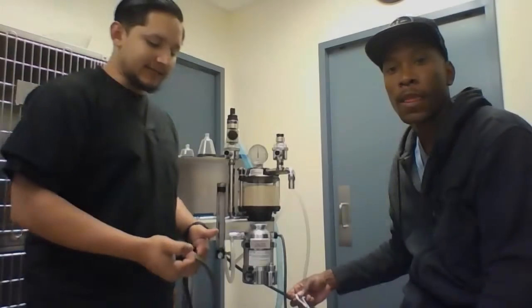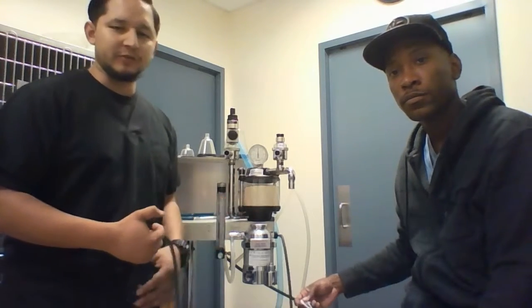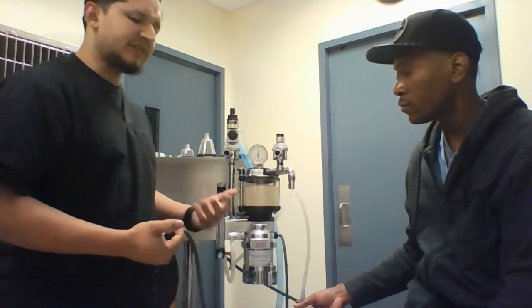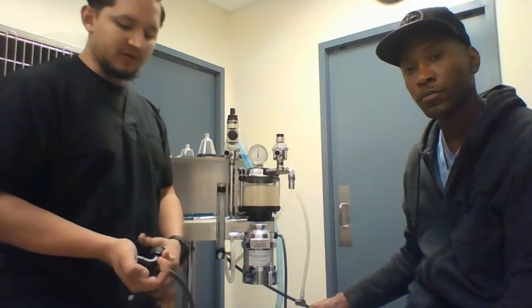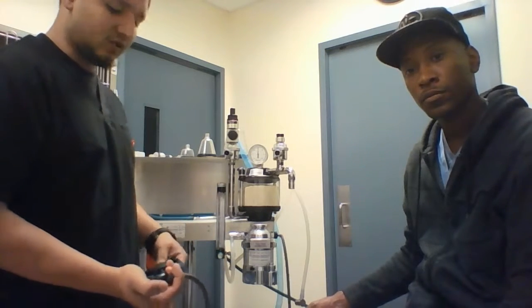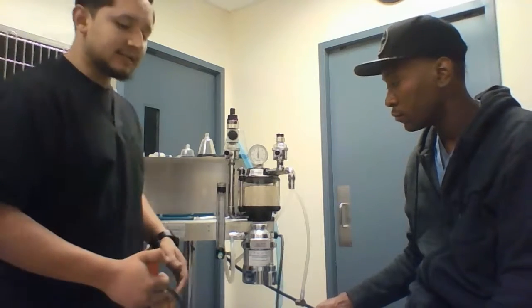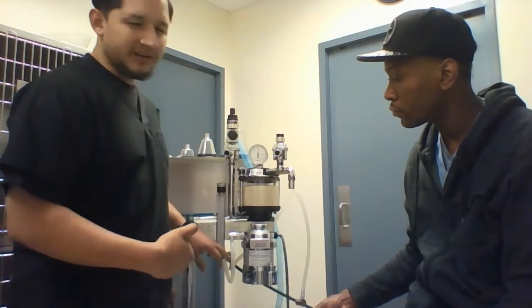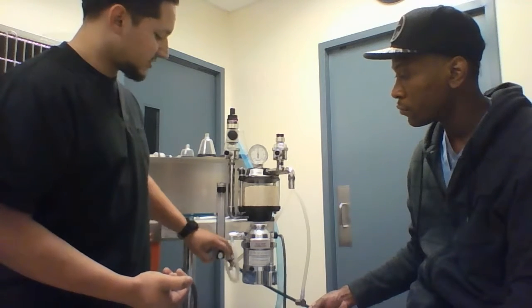So today I'm going to be pressure testing the non-rebreather system that Avery just set up for me. It's always good to test the non-rebreather system to see if it holds air, because sometimes this old rubber does wear out with time, or the reservoir bags do crack, and they become brittle with time. The way you're going to test this is to open your flow meter to around 10 to 15 liters per minute, just to fill the bag fast.